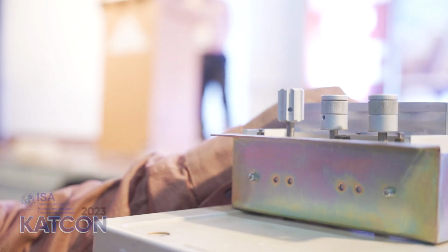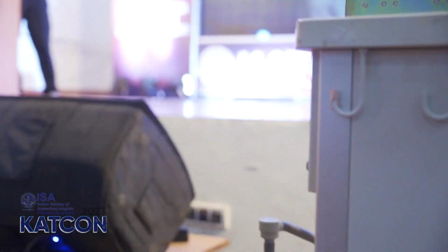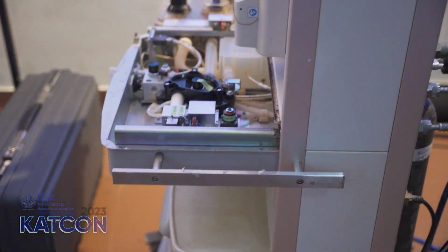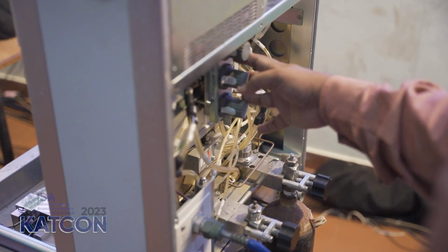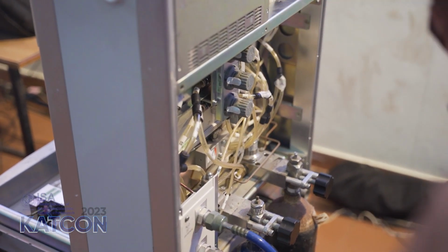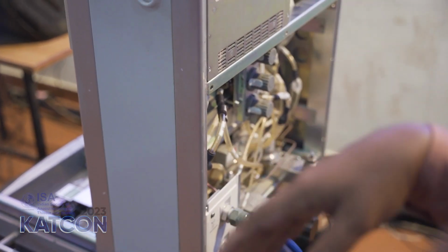And some machines have a pneumatic system, but in this workstation we are using this mechanical anti-hypoxic device. So this is possible by reducing this pressure with a second stage pressure reducer. And there are so many other components, and the controls are electrically and servo driven, and I am not going to detail that also.